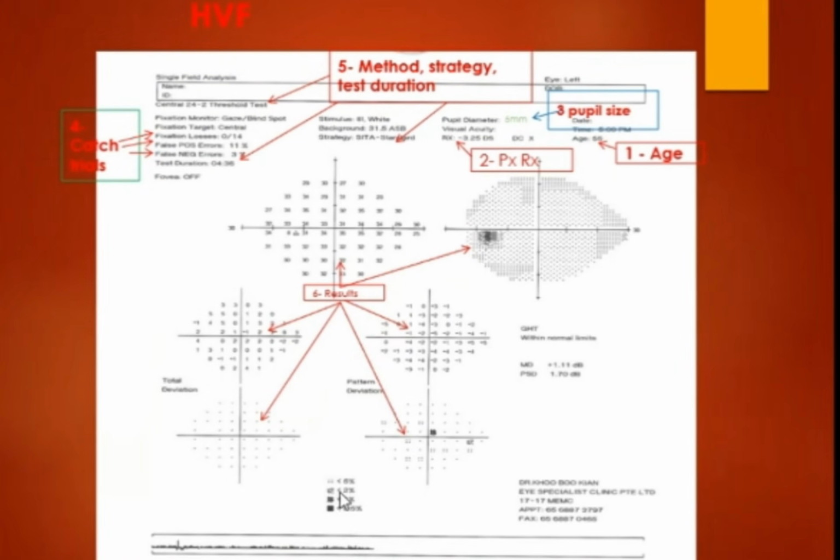The second one is less than 2% of the population having this defect. So you can say that the second one is severe compared to the first one. Then the third one is showing us less than 1% of the total population within that particular age bracket. Of course, this is a worst case. And then the worst of them all is the last symbol, which is very, very thick.